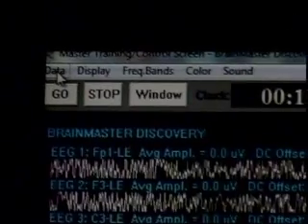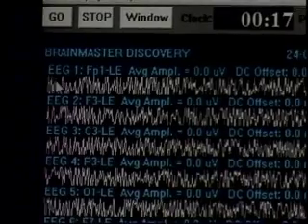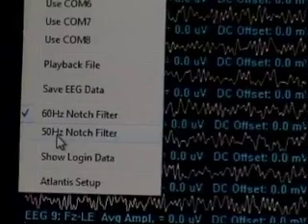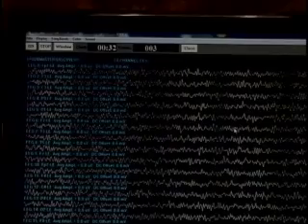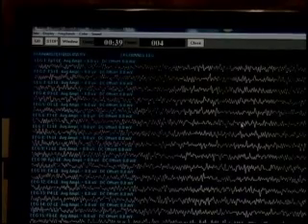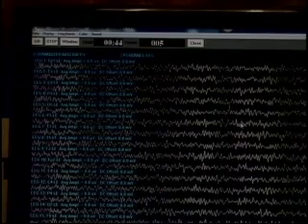However, I'm going to go up to the upper left-hand corner to data. I'm then going to go ahead and turn on my 60 Hertz notch filter. Okay. And then I'm going to turn on the 50. You notice now that we have a signal that resembles EEG, but this was literally filtering a complete noise signal. So that's just a good indicator that you want to make sure those filters are off when you start, because you don't want to be tricked into thinking you have good EEG when you really don't have any signal off the scalp.